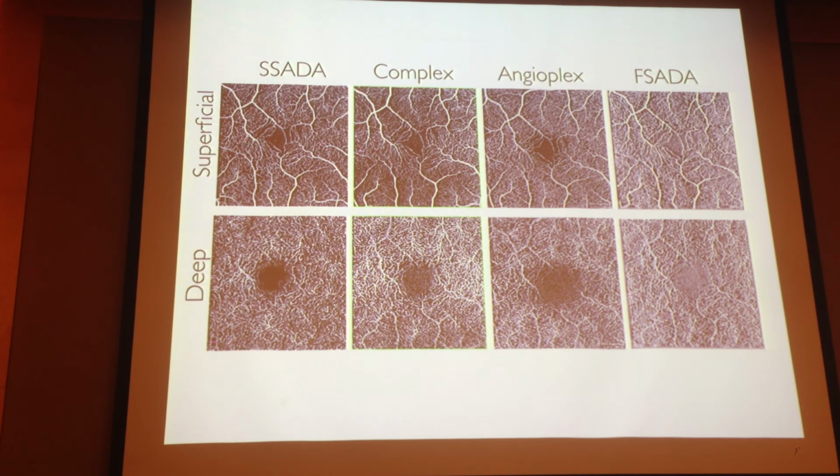So it's not only the image, but also how you play with the image. Heidelberg has a different series of contrast, and of course, if the signal is low, you get more noise, and that probably is just noise in the image.